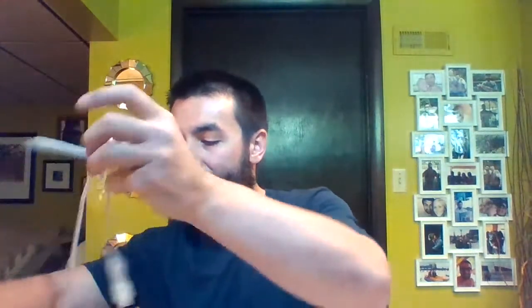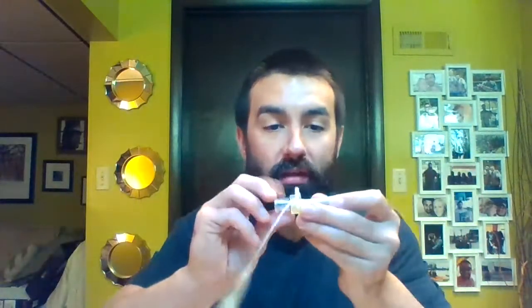Okay, so we talked about the different Shiley Bivona trachs. I showed you a regular Bivona TTS. I've showed you these other ones in class. Okay, so we have the extra length Bivonas with the Hyperflex. These come in a bunch of different lengths. Most of the more recent ones actually tell you, 110 millimeters, 120 millimeters, 90 millimeters, something like that.